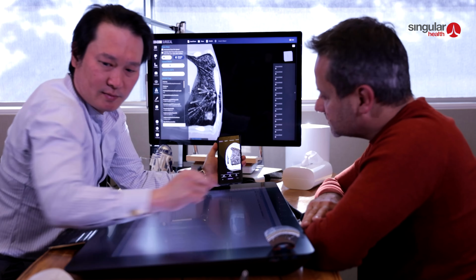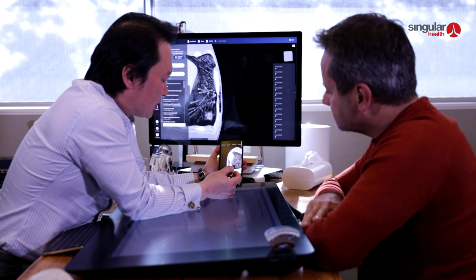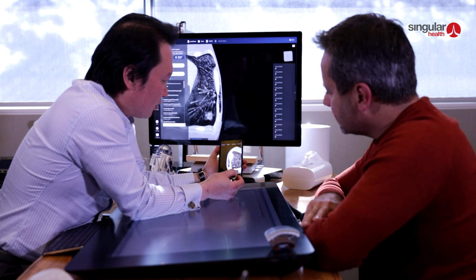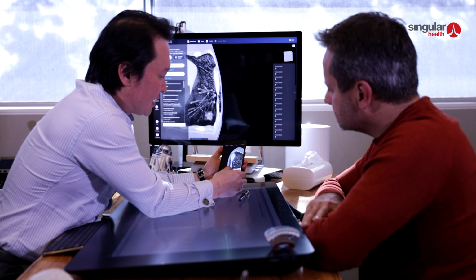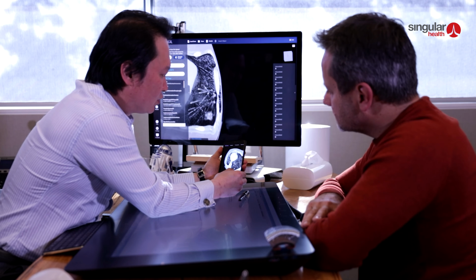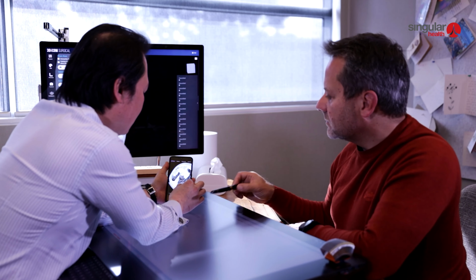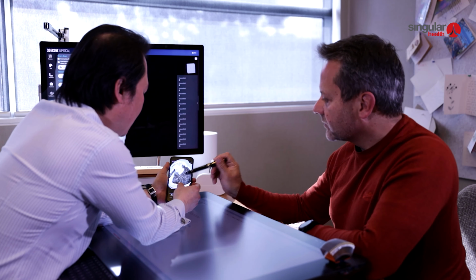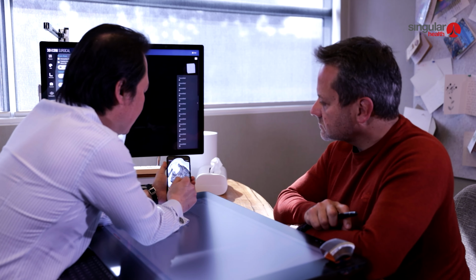What the radiologist will do is stick a needle into that lesion there. They'll probably either go through from there, in between the ribs, or they'll probably go through here, which is a shorter route. It really depends on what they decide. They'll have a look at the CT scan and orientate themselves as to which position is the easiest way to get to the lesion. If you have a look, that's the lesion there.